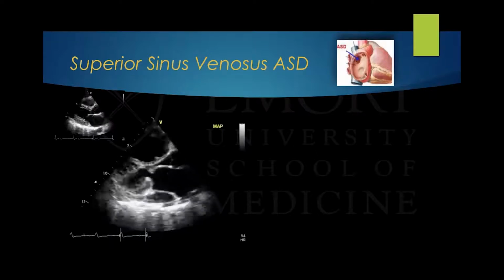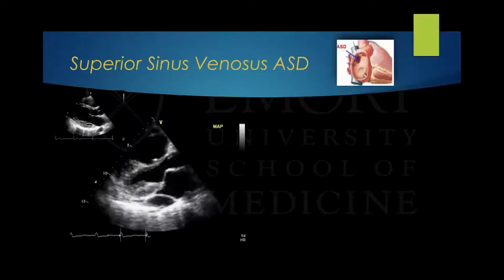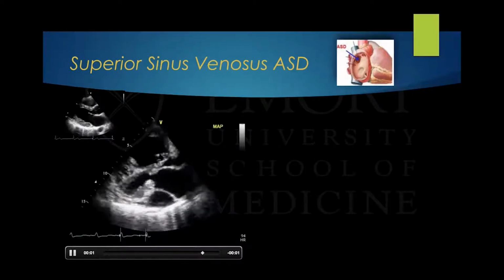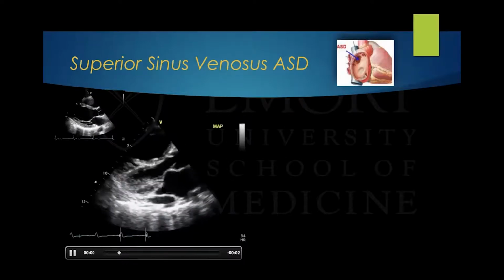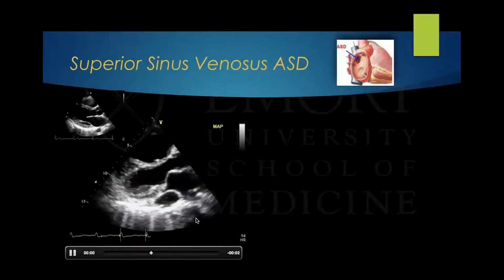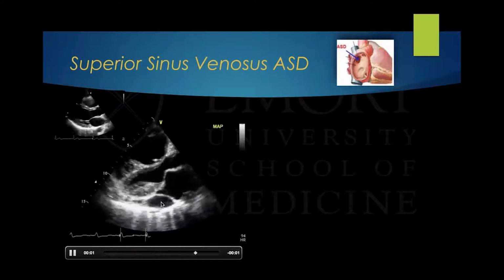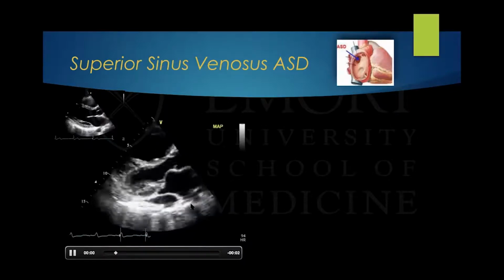Some of the slides will have a normal heart on top, so you can actually see what the normal versus abnormal ventricles look like. This particular case has a very dilated right ventricle. There is a prolapsed mitral valve with some thickening, but there's also a very dilated coronary sinus because sinus venosus ASD can be associated with persistent left SVC. So the persistent left SVC will drain in the coronary sinus, dilating it, and this is the appearance on the echocardiogram on the parasternal long axis view.